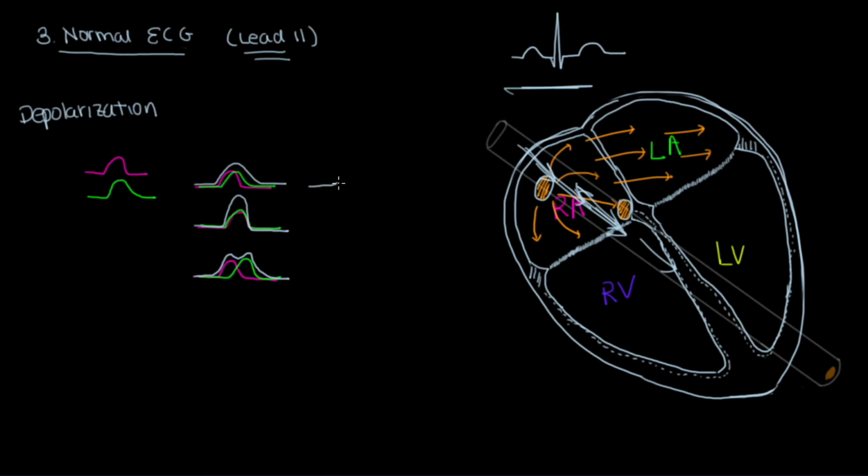So here again, normal would kind of look like this. If the right atrium is messed up, then you may end up with something more peaked and narrowed. If there's something wrong with the left atrium, what may happen is it looks kind of notched like this. Now, we're not going to actually go over each of the pathologies that would create all of these things, but just giving you a sneak preview in terms of why it's helpful to understand that there are actually two different contributors to the P wave, as opposed to just thinking of it as a uniform P wave. And it'll help you understand, hey, why does a specific type of abnormality lead to this type of specific change?